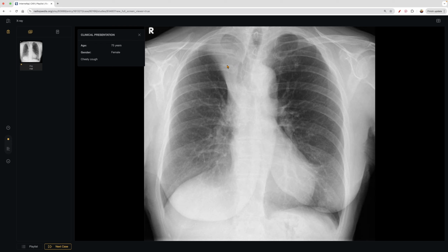And so in this case, we think about our lung pathology. Is this an interstitial opacity? Does it look hazy, like a faint haze? No. Does it look like a consolidation? Potentially, but the distribution is very off. And then if we go to the next aspect of the ICAN mnemonic, atelectasis, it actually presents like this. And atelectasis has a kind of predisposed way that it likes to collapse. We won't go into that in this kind of video, just because it's a bit more advanced and difficult to appreciate. But this would be atelectasis, right?